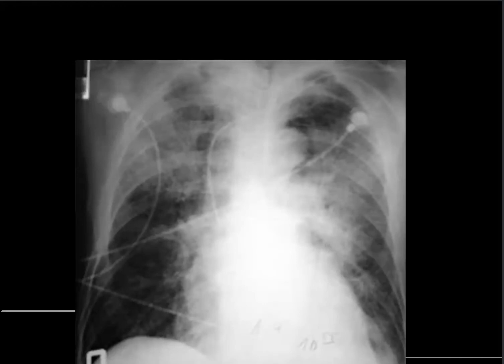Now what about this? Where's the pathology here? Well, there's not always just one pathology, there's two abnormalities here. There's shadowing here in the right upper aspect of the lung, and the shadowing here in the upper aspect of the left lung. This is obscuring the right heart border a little bit, and this one's obscuring the aortic knuckle.